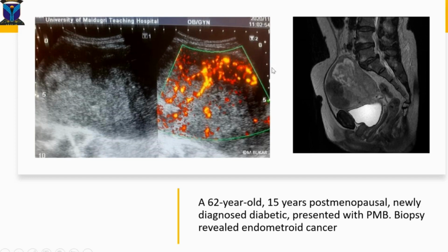This was a case of an endometrial carcinoma. Look at the beaded appearance here. Microaneurysm, stenosis, microaneurysm, stenosis, branching, looping, all features of malignancy.